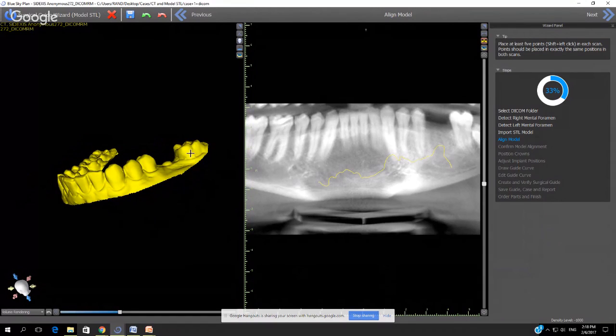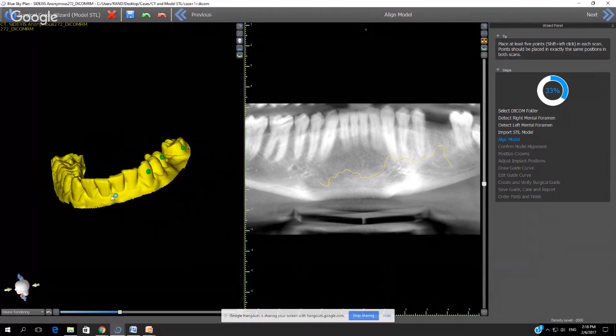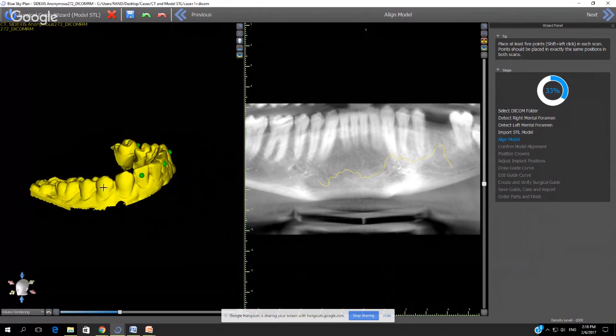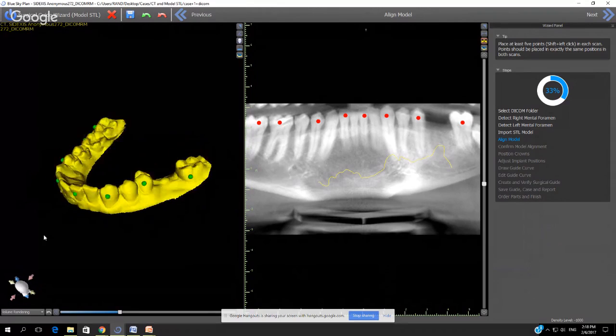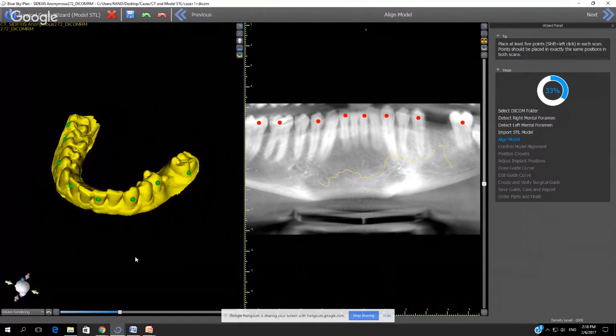What we're going to do now is mark the teeth. This is a very advanced process in terms of the fact that you don't need to mark an exact location on a particular tooth. What we're essentially doing is we're tagging the teeth. I recommend tagging every other tooth. That usually guarantees a very good merge, and especially the back teeth on either side help with an accurate merge.